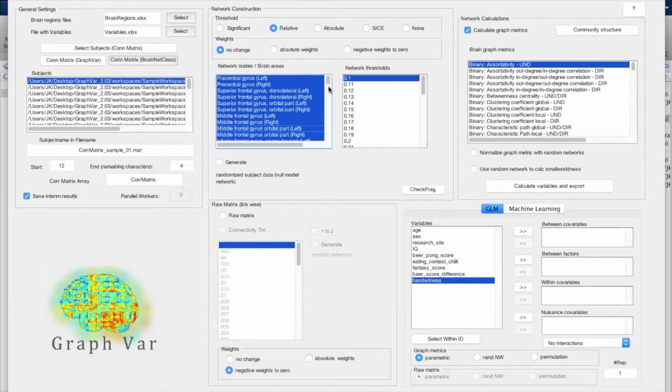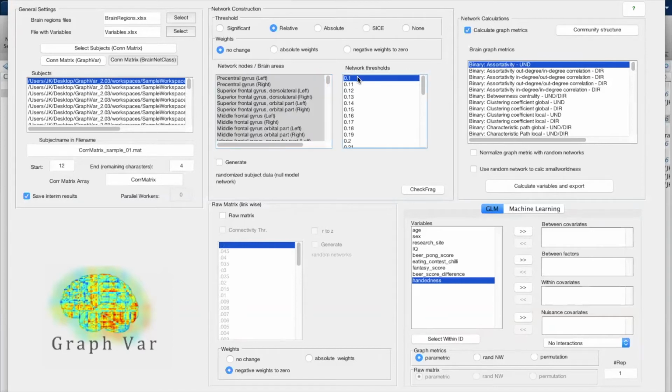Also in my previous talk, I said that it is always important to show that you have different network thresholds. You do not only compute your graph theoretical metric for just one threshold and then compute a statistical association with some clinical data, because it could be an artifact that you find this strong association in here, but on those two subsequent thresholds, you do not find it. That's why it is good practice to use a lot of thresholds, right? Here you could go in increments from the 10% strongest links to including the 50% strongest links in the network. So this is called the sparsity, right?